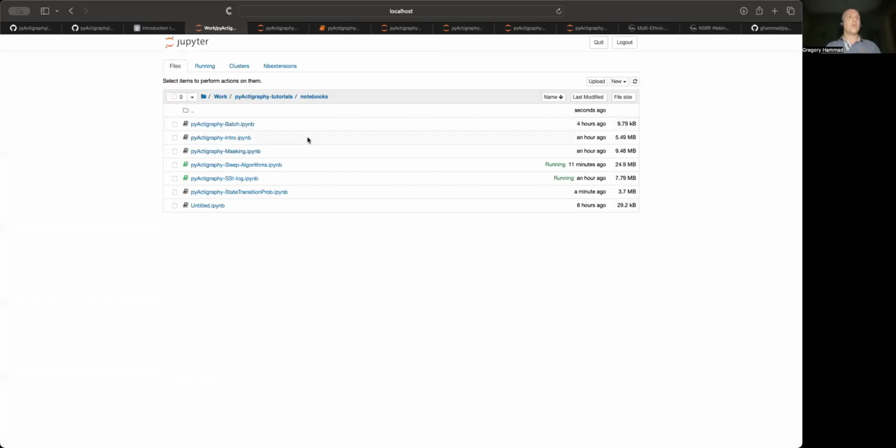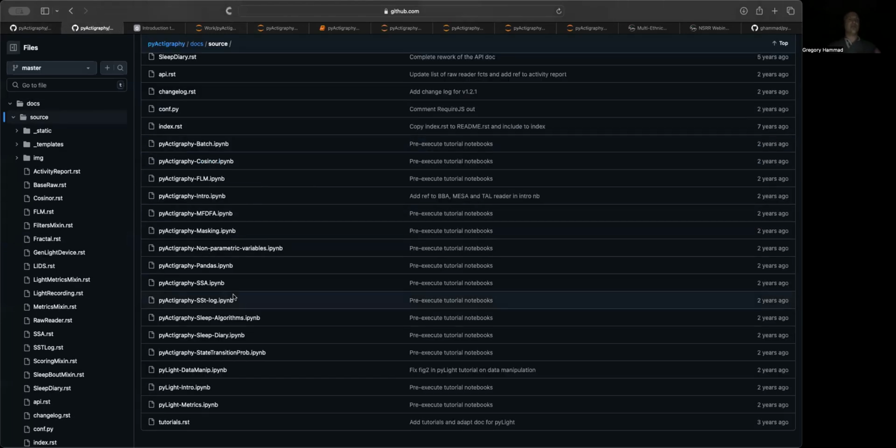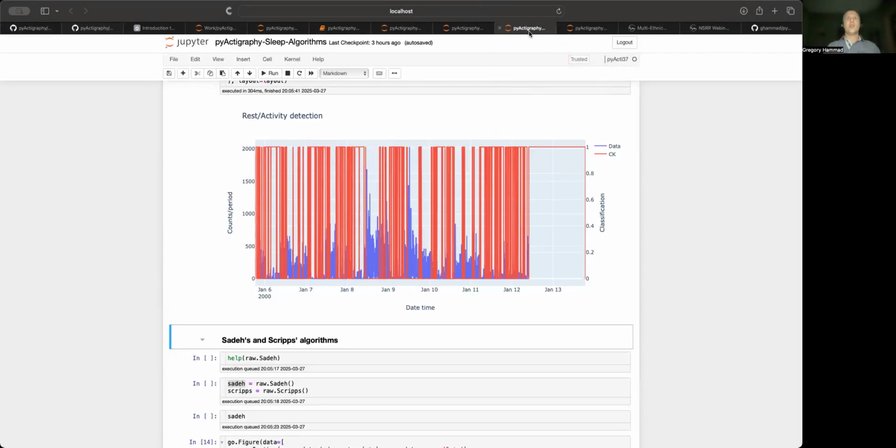Another one that maybe is worth going over, we can see more of these in the breakout session if you want. There are more advanced processing things that we also set up here, but we need to master the basics first. So this is what we wanted to highlight today.